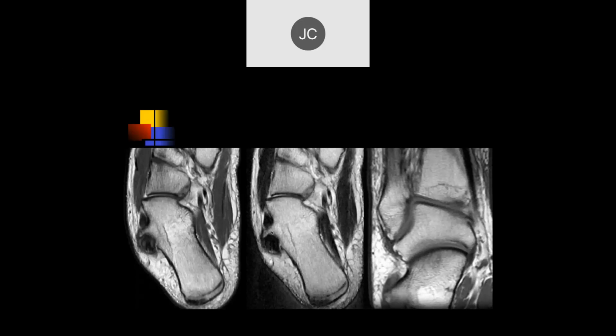This can produce, when you flex and extend the knee, rubbing of the peroneus longus against this fixed bony prominence. And as you'll see in a minute, what happens is it tenses the peroneus longus tendon, which can cause irritation, tendinosis, and occasionally, eventually, a tear. Often it's associated with bone edema, and you can get symptoms both from the bone injury as well as the tendon injury in these patients. And this is what it looks like in the coronal plane.